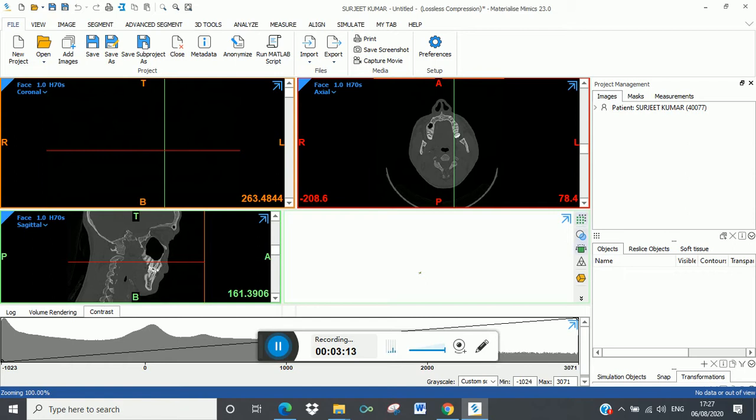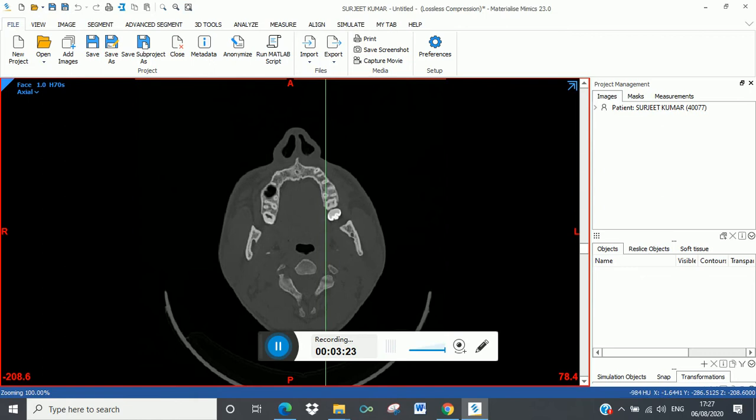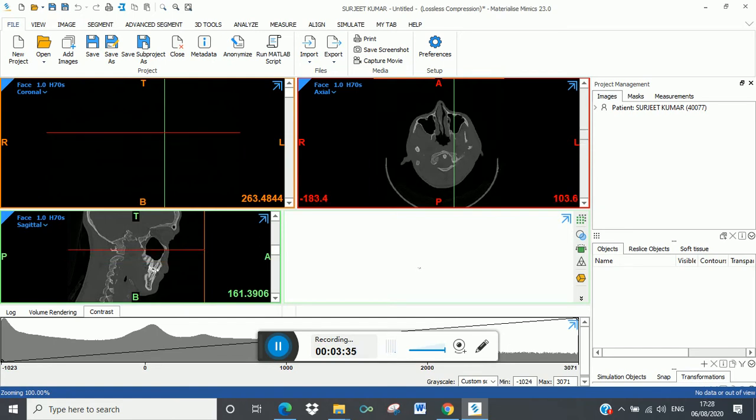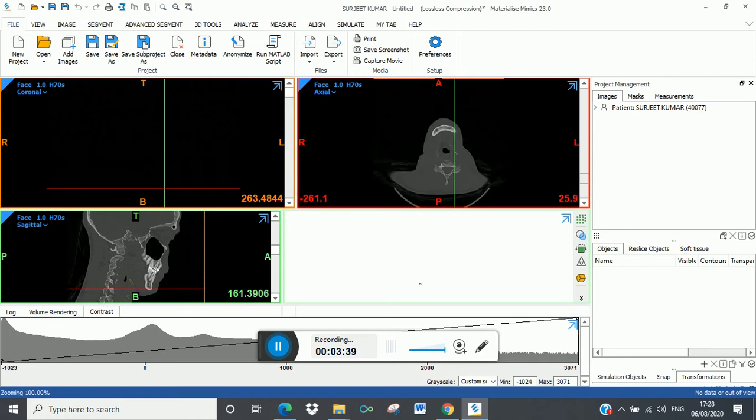These are the different tools that are available, right? To increase the screen size, you can click here, expand screen option, full screen option, and click on any view. You will get an expand option, right? Then again you can unclick that and the screen minimizes, right? So again, the first thing that we'll now do is we would want to first read the scan, right?